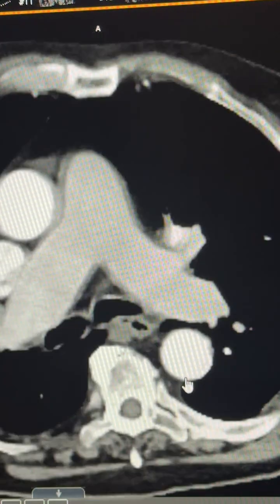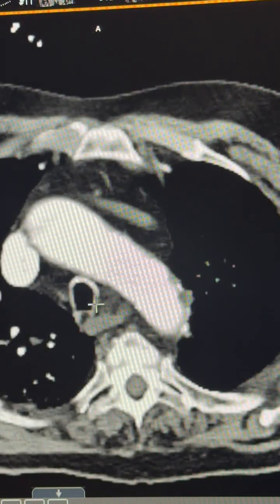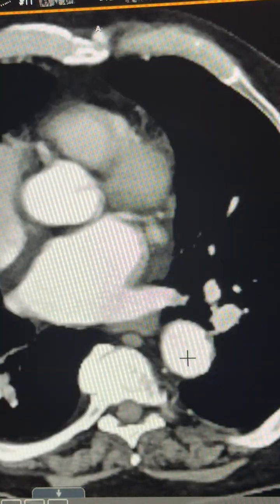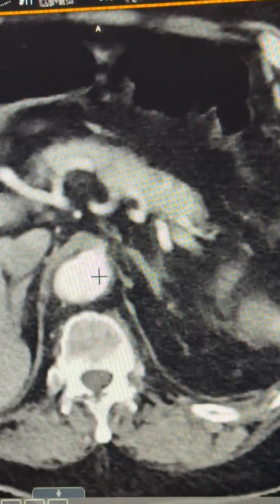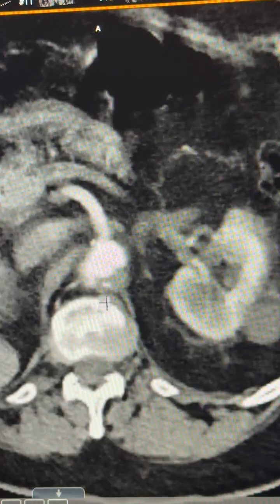And you can see that he has 2 aneurysms. He has an aneurysm in his chest, right there on his heart, which measures 4.5, and probably is not going to be a problem for any time soon. His descending aorta looks okay, sort of curvy, tortuous we call it. His intestinal vessels look okay, and then you see a little bit of degeneration right here with thrombus in the aorta.